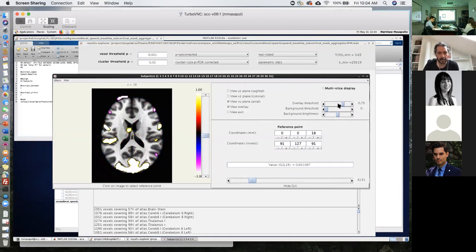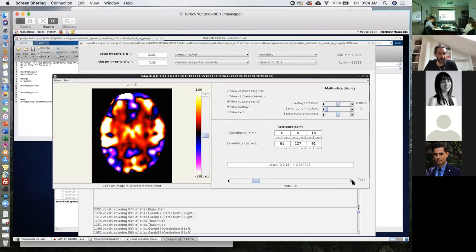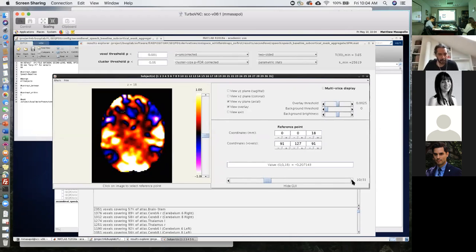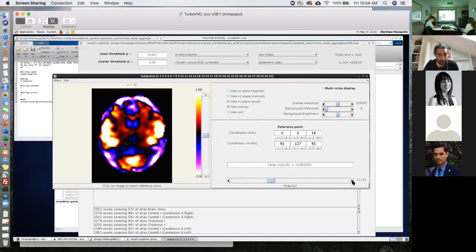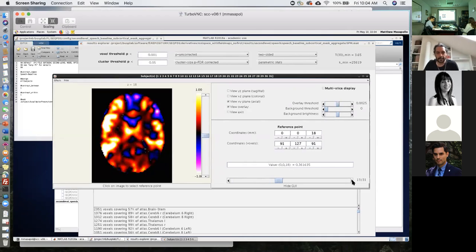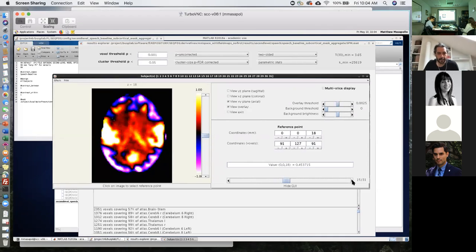And if you move across subjects, you will see that the actual location of those regions is slightly varied. That is not exactly the same regions, right? So there are some voxels that appear to be outside of the brain in one particular subject and not others. Well, so if you set it at 0, what's black is masked out, or blue? Black. That's right.